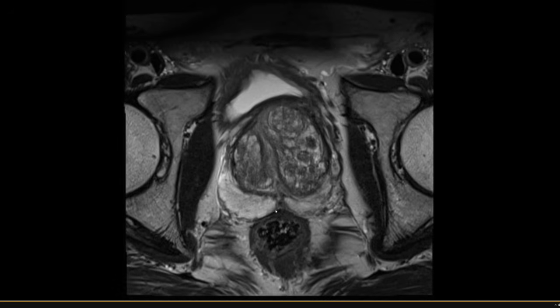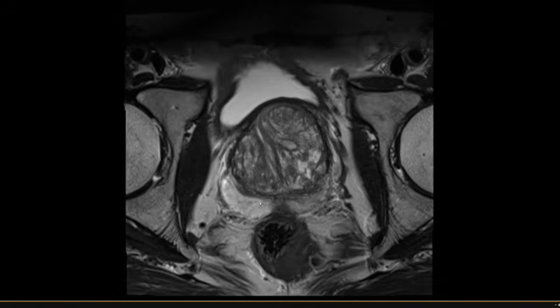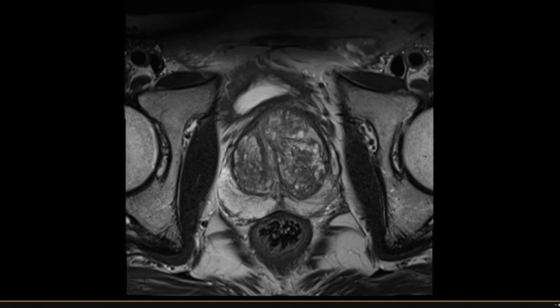One thing that's important to know about the prostate is that it's actually not surrounded by a true capsule. Although people will often refer to cancer spreading out of the prostate as extracapsular extension, there's really no actual true capsule here. Instead, there is a condensation of pelvic fascia along the periphery, and you can see this T2 hypointense band here. Another structure that people like to refer to is this hypointense line between the TZ and the PZ, and that is referred to as the surgical capsule or pseudocapsule. Again, that's just compressed tissue.